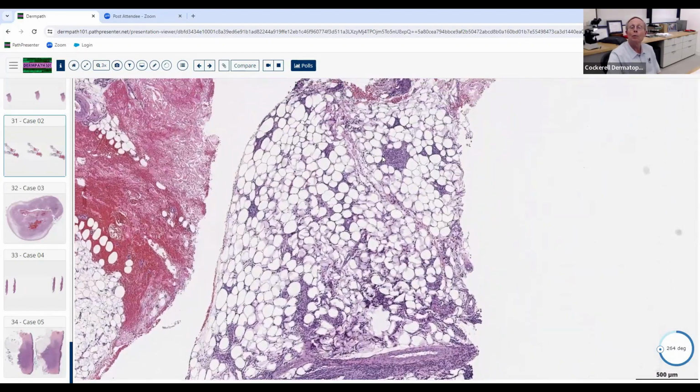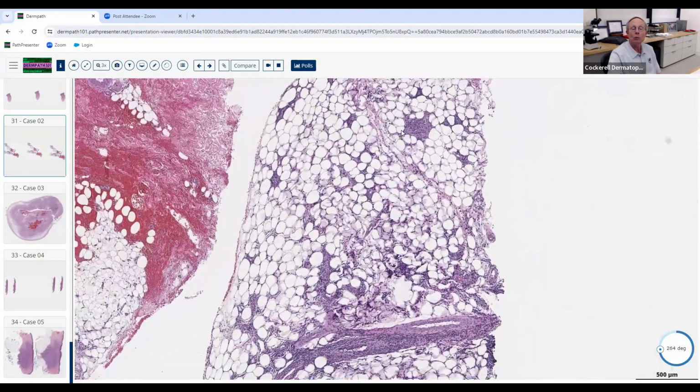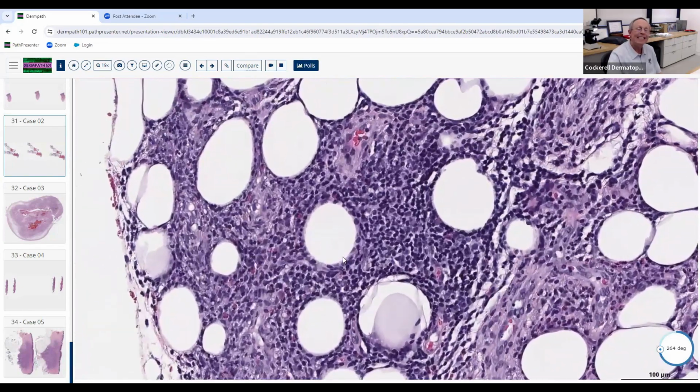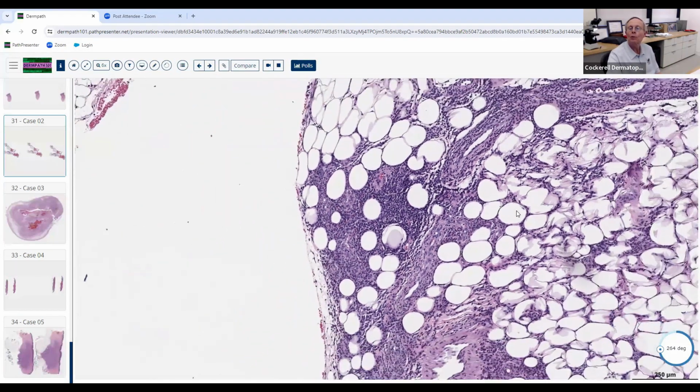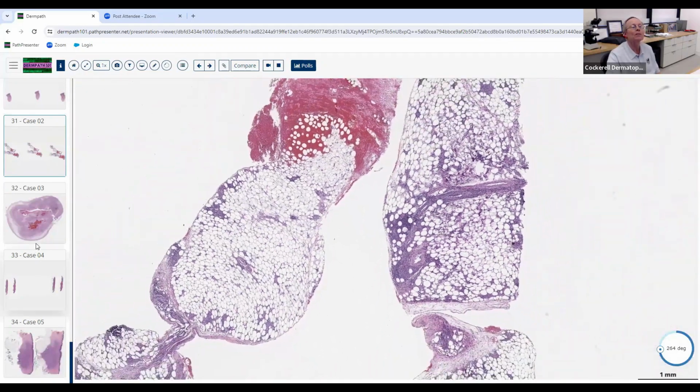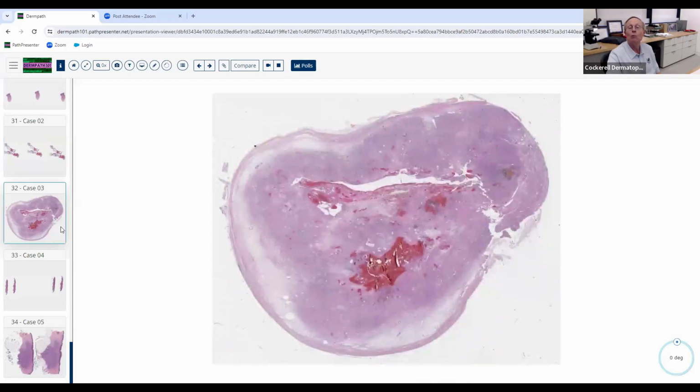So this is an unusual panniculitis. Mainly, I just wanted you to recognize the pattern. It's probably some kind of what we call an eosinophilic lobular panniculitis, which is sort of analogous to Wells syndrome of the fat. You kind of think of it that way. I'm not sure you'll even be asked that on the boards, but it's just basically showing you the pattern of the panniculitis here and ruling out those other things.